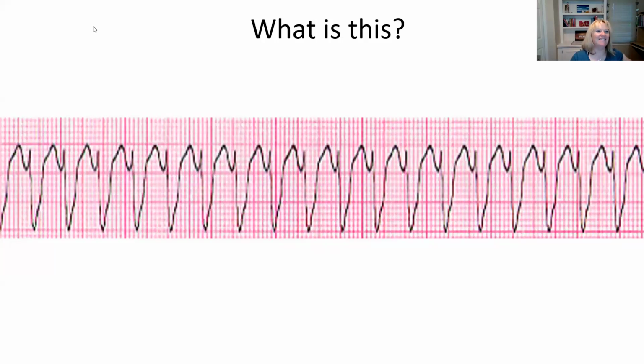Yes. VTAC. You have the fastest fingers ever, KJ. You're the one to beat, right? So it's VTAC, but how do you know that? Can you guys tell me why it's VTAC?